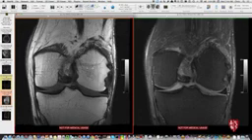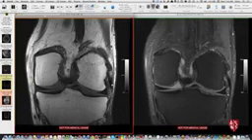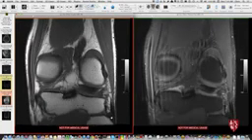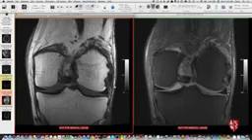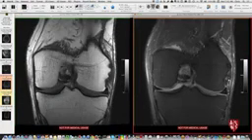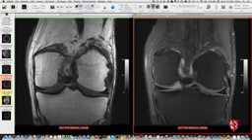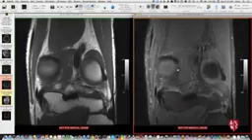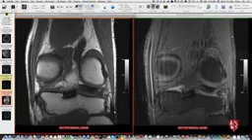And then that's going to go down obliquely, and I have to scroll posteriorly to find that fibular collateral right in here where the hand is, going down to the fibula here. So again, I have to go find it on the T1s, and then on the PD over here, you can find a little bit of signal over here, but this ligament is pretty easy to identify if you know where to look. Then the other lateral thing, so posteriorly, is the biceps femoris muscle and tendon here coming down, and that has this conjoint tendon coming down to the fibula with the fibular collateral ligament. Okay, so those are posterior structures in terms of their distal part.